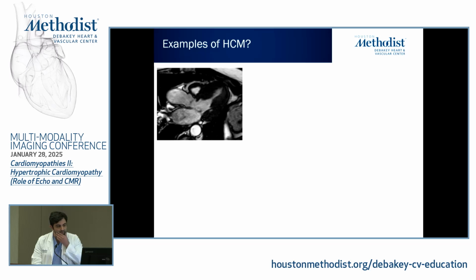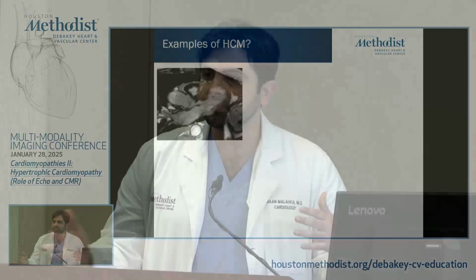So here's this patient with asymmetric hypertrophy, sigmoid-shaped septum, and you notice that there's also a bit of a subaortic membrane. You see the flow acceleration. There's no clear-cut SAM. What do you guys think this is if you just had one morphological assessment? HCM, maybe not HCM. What if I told you she had a gene positive evaluation, so she has one of the sarcomeric mutations of HCM?